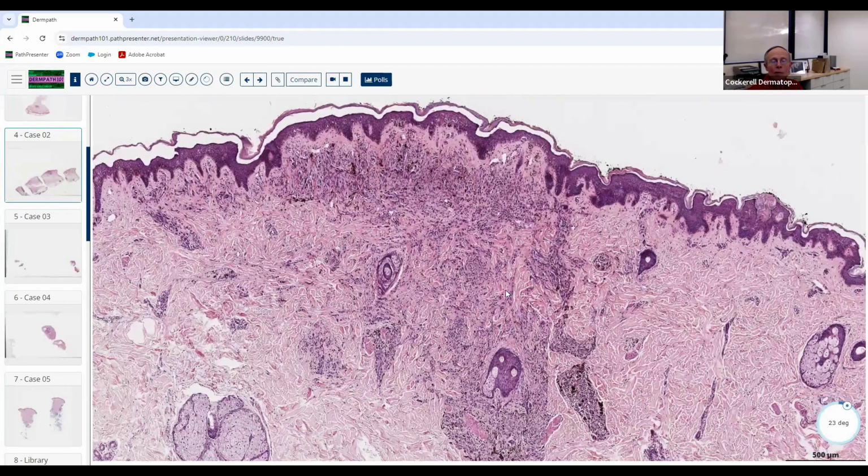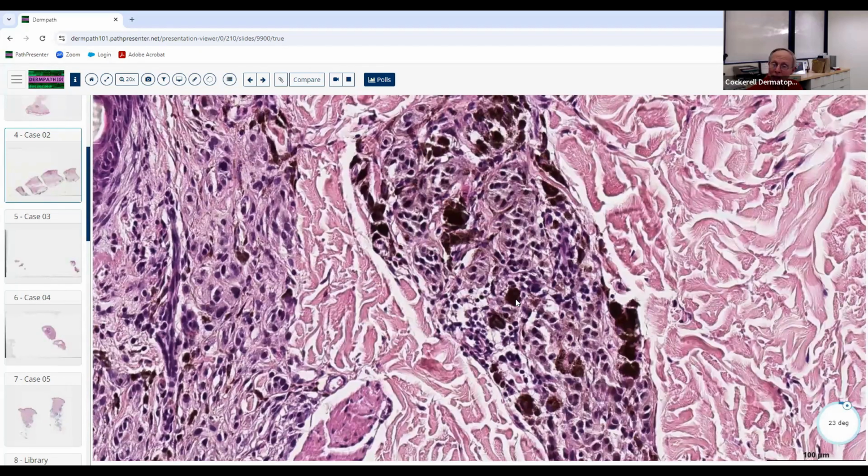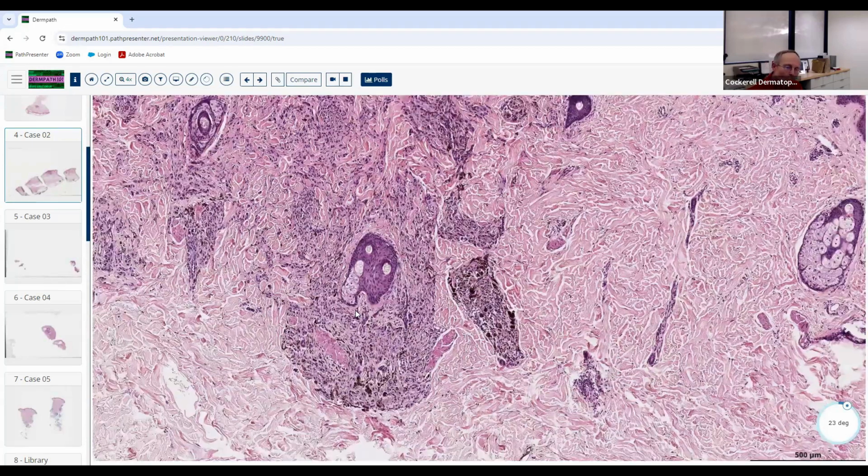You're probably not going to encounter this on the board examination. It's a little bit esoteric, but this is basically a variant of a nevus, not melanoma. So that's important that you recognize that. Now, you may read in the literature about this whole new terminology people have introduced over the last few years of melanocytoma. I don't really want you to worry much about that either. It's kind of confusing. It's more of a genetic, hypothetical story that says, we see these lesions and do genetic studies and they have one mutation, and we think if they stick around long enough and a second hit comes along, they're going to turn into melanoma.